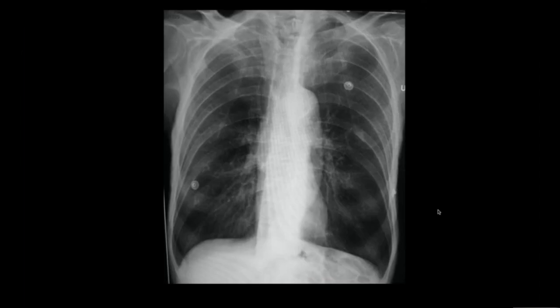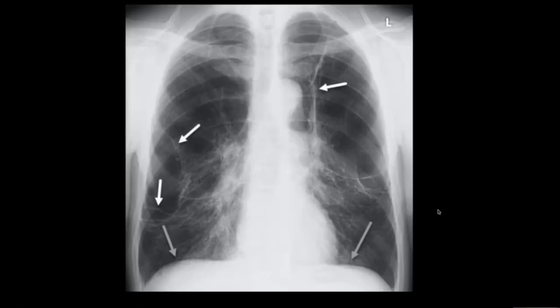This chest radiograph is showing hyperexpansion of both lungs with thinning and tubular shape of the mediastinum, and flattening of the diaphragm. So these are imaging changes of a chronic COPD patient. This is another chest radiograph of a patient with advanced COPD. There are multiple areas of lucencies, devoid of vascular markings, with thin walls, consistent with multiple bullae.